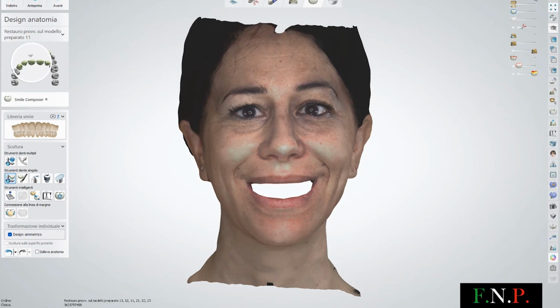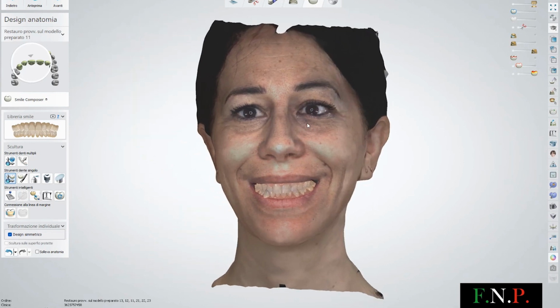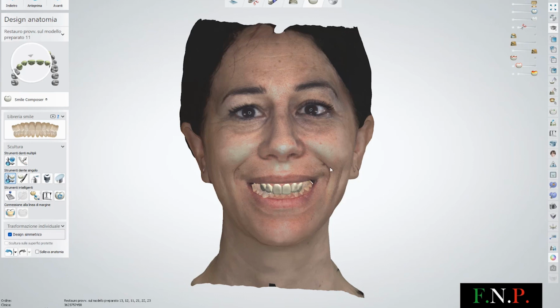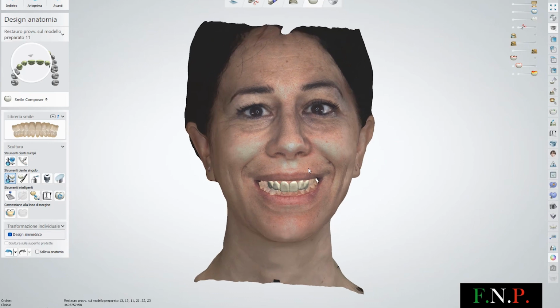and I insert the patient's TRIOS intraoral scan. There are also the teeth that I was modeling, and I can make adjustments regarding the patient's face. This is a totally acceptable scan. With this technique, it is clearly usable with all scanners. This scan, let's say it's fine anyway.